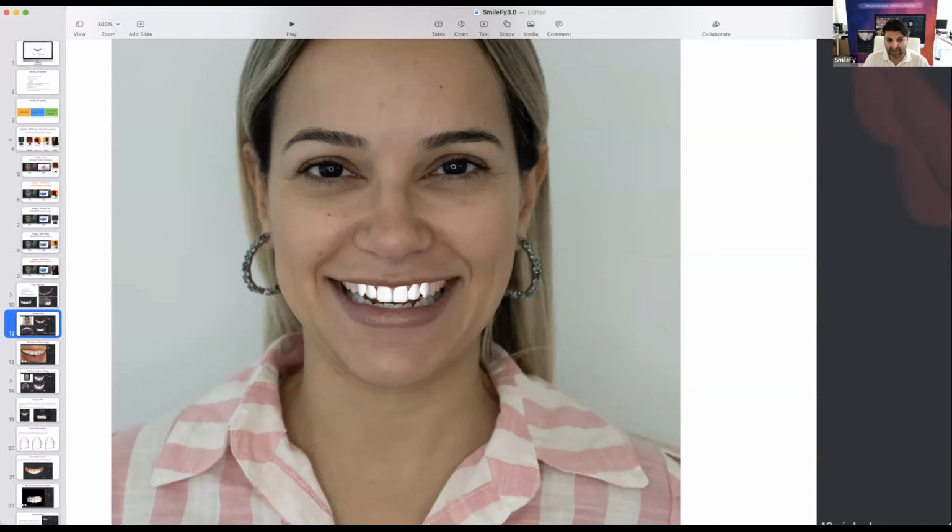Now, with these dots, I deform the surface, the buccal surface of the tooth, in a way that I don't destroy it. I just reform the surface and make it very, very precise to the patient's gingiva, keeping the quality of the natural tooth.